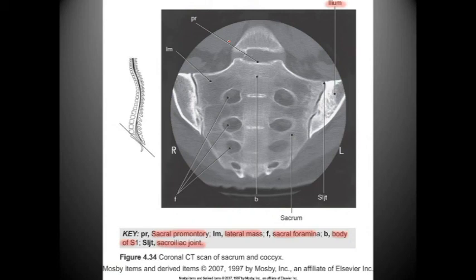And here is kind of an oblique, if we're actually just having the patient lay flat on the back and we're scanning coronally through. But notice that this is the correct view to actually see the sacral foramina. And I challenge anyone to have actually shot a better sacrum and coccyx than what you will see on CT, because there's no way that, on your best day, you could actually achieve this with conventional radiography.